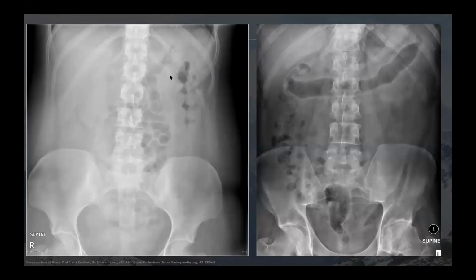I thought this was also probably a good opportunity to discuss the other findings of IBD on radiographs. So this one on the left here, the abnormality is in the descending colon. And this is something called thumb printing that I'm sure you've all heard of before. But you have these edematous, swollen mucosal indentations which occur in the context of acute inflammation. And it's like someone has sort of popped their thumb into the side of the bowel. So that is acute. This on the right is chronic.